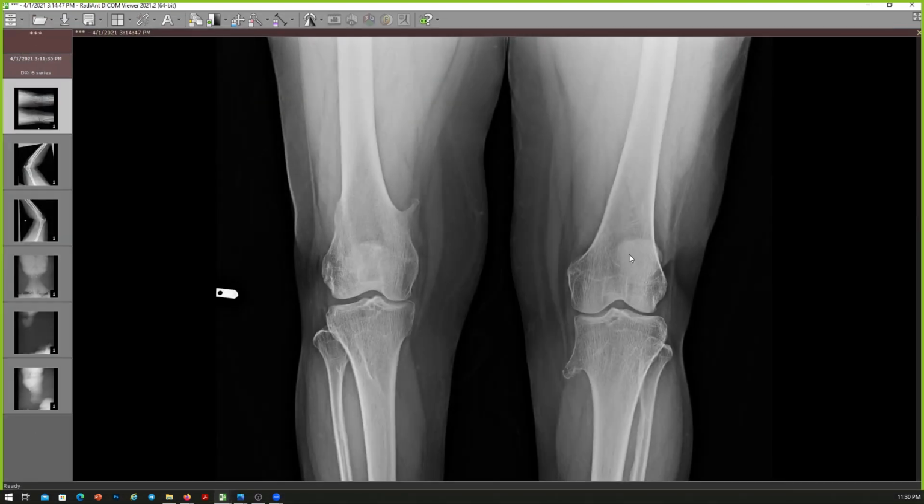Okay, have a look at this case, please. This is the bilateral knee X-ray, frontal views, for a skeletally mature patient. I can appreciate evidence of multiple bony exostoses involving the right distal femur and left proximal tibia. They are seen mainly at the metaphyseal region, going away from the joint space, and there's a continuous medullary cavity within them.